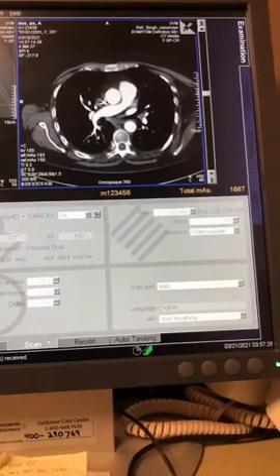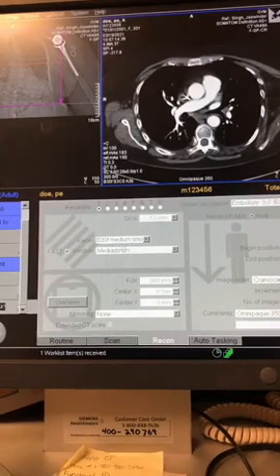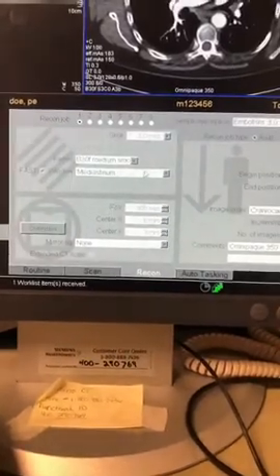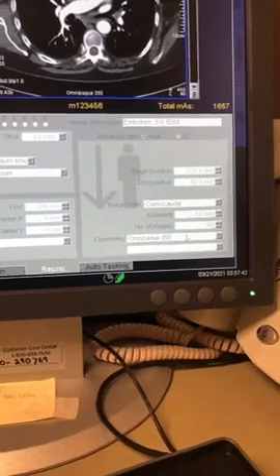All right, if we look at the reconstruction tab, I think this is the same window as our regular chest, if you remember. Our kernel and our window are the same. Notice down here in the comments that we're using Omnipaque 350, but we've kind of talked about that.